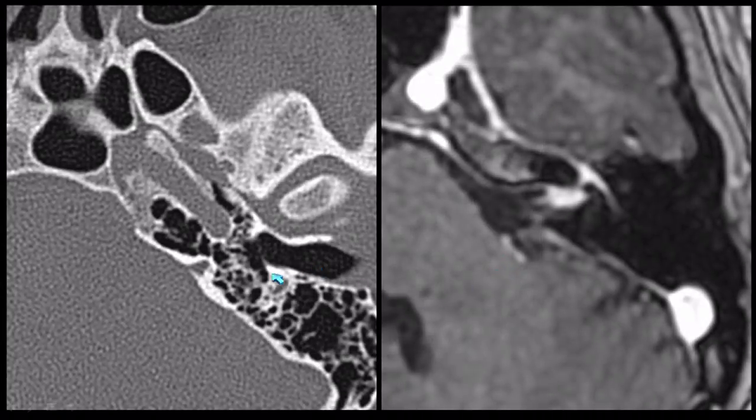So on imaging, we see these very well, and we know that there's some enhancement that normally happens around it. So we're frequently trying to figure out, is there too much enhancement along the 7th nerve itself? So here's that horizontal segment of the carotid, and we see those little fibers of the greater superficial petrosal. They're nicely enhancing here in this pathologic case. There's always a break here at the horizontal segment of the carotid. That's where those sympathetic fibers from the carotid join the parasympathetic fibers from 7, and together they form that pterygoid or Vidian canal going anteriorly.